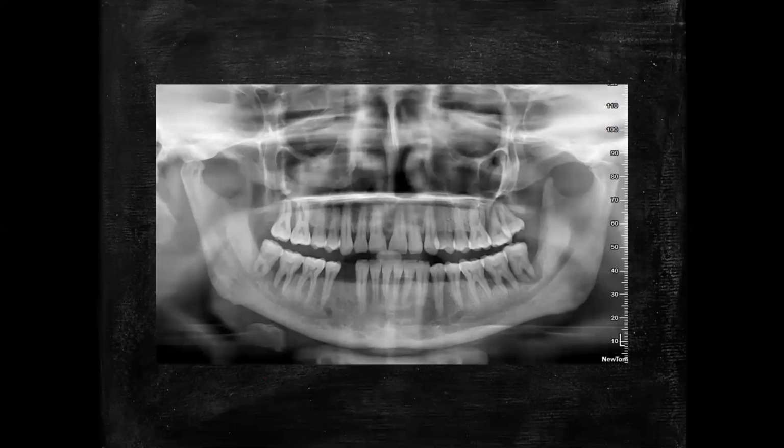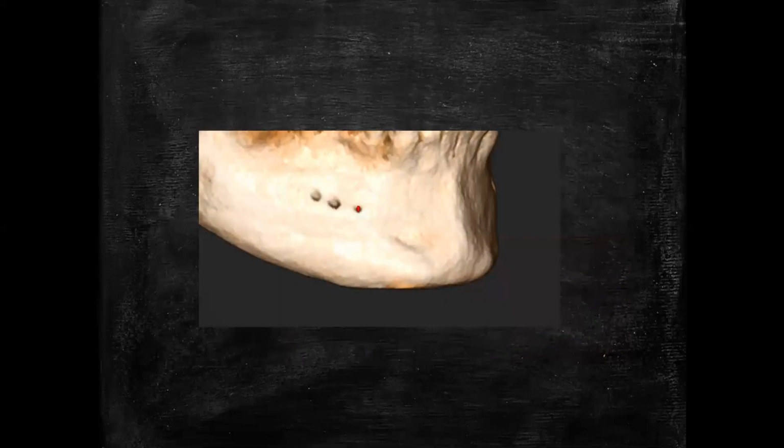Like a simple example. Now in case we have a panoramic image for one missing tooth, it's quite a simple case. Most of the dentists around me, I know, would never even go for a CBCT. They would take a scale and just measure it, do the clinical examination, and go for an implant placement. But you never know that this 3D image will always provide you much more detail.